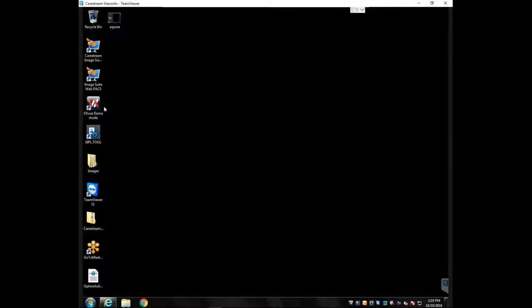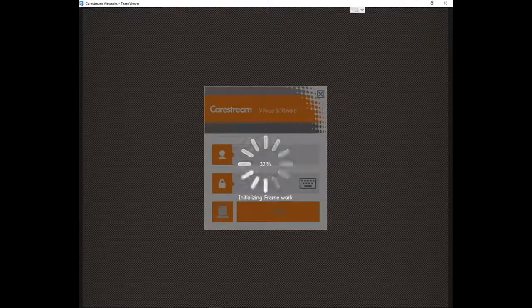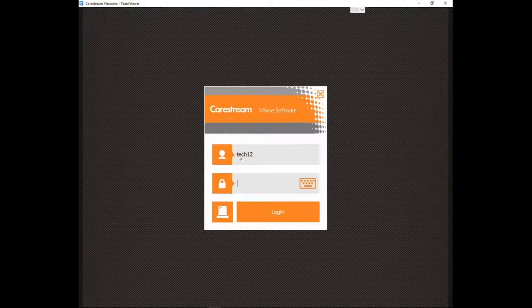And today we're going to do the CareStream Pro software. Double click on the VXVue icon on the desktop. Login splash screen will appear. When prompted, just key in the password.